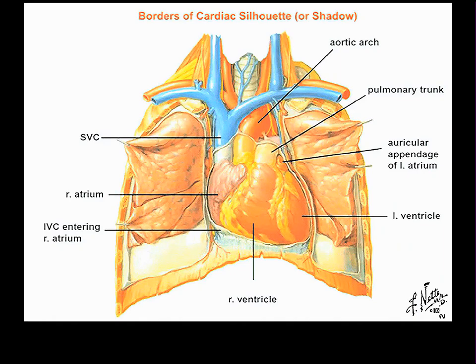All right. Do a chest film. You want to look at lungs for sure. All right. You also want to look at the heart for sure. And radiologists refer to the image that the heart makes on a chest film as the cardiac shadow or the cardiac silhouette. And it is more than just the heart itself. In radiologic terms, the cardiac silhouette includes the heart and the great vessels, such as, now, we get into a problem here. I know you have not dissected the superior mediastinum.